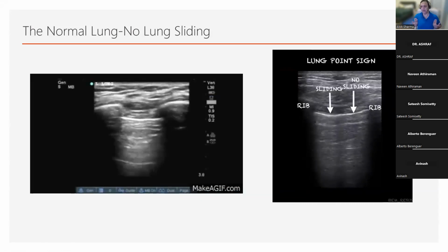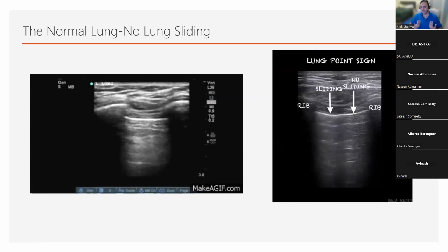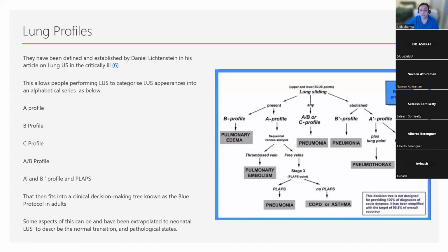In an anterolateral pneumothorax, if you have air that's accumulating, moving all the way to the posterior axillary line, that's a pneumothorax that's getting worse. Whereas air that's just loculated anteriorly, if you can see the lung point at the anterior axillary line, well, that's just anterior air as you'd see in a small anterior pneumothorax. So you can actually use the lung point to quantify how severe your pneumothorax actually is.